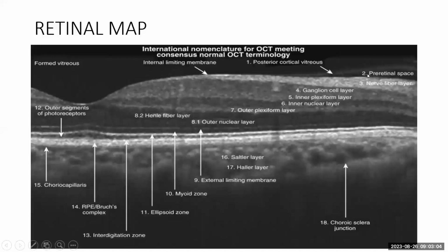The space in between is the pre-retinal space. This fine hyperreflective area is the ILM. Sometimes you have to look closely to see it, but it's almost always there, except if peeled during macular hole surgery or membranectomy and ILM peeling for other retinal pathologies, especially diabetic retinopathy.